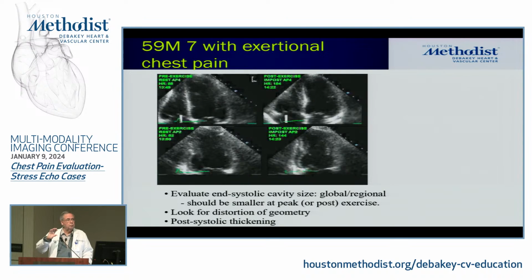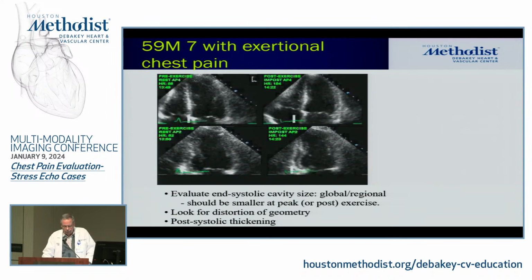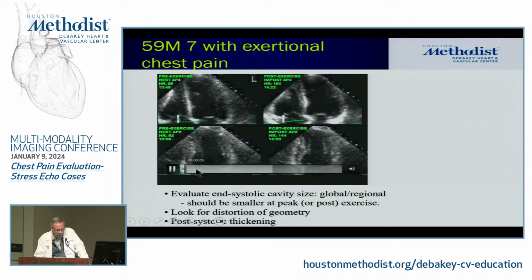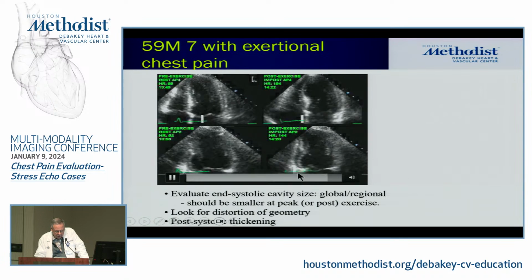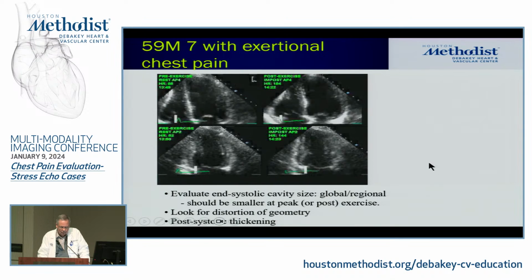And a lot of false positives actually happen in that area, where people get confused, are not sure, and call it abnormal. But notice that right here, this is thickening throughout systole. Now. And then I don't know if I can try to stop it and see. There. This is your end-systolic diameter here. Now, watch this here. This is thickening. This is also thickening. But when is it thickening? Now.